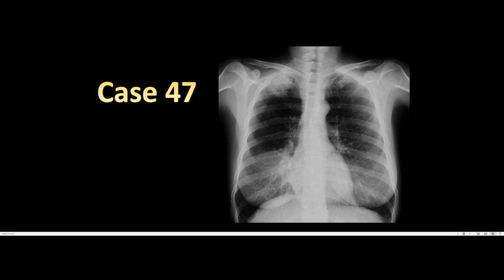All right. Everything else looks normal. On top of that, you might see that the pulmonary vascular markings might be more visible. But again, in this female patient, what we want to mention is the obvious: this is a case of Pancoast tumor. All right? Maybe she has TB, maybe she doesn't. Maybe she has Horner syndrome, maybe she doesn't. Maybe she has lung malignancy. We don't know. We will need a chest CT and the patient's history. All right? So Pancoast tumor, maybe. And we have pulmonary vascular markings that are visible here. It could mean pulmonary congestion, probably.